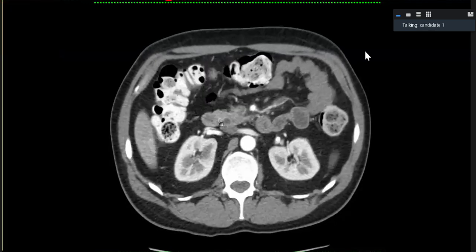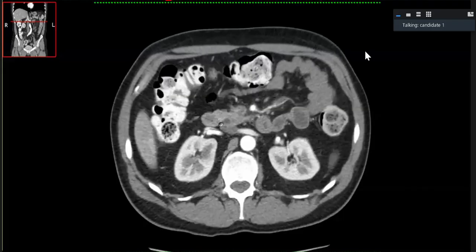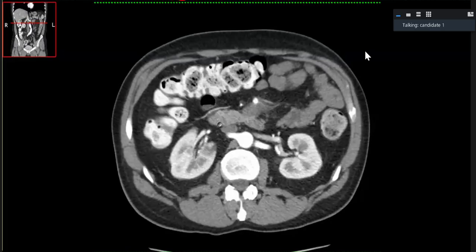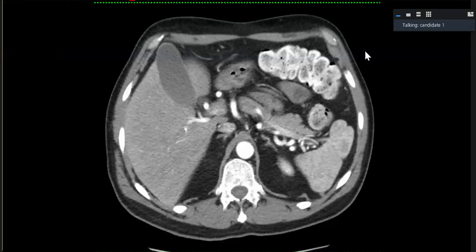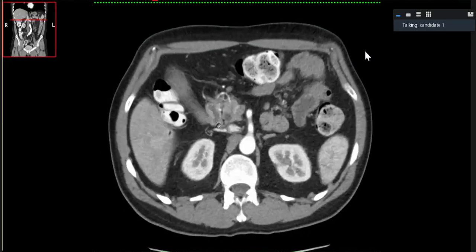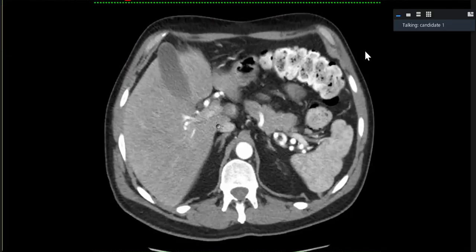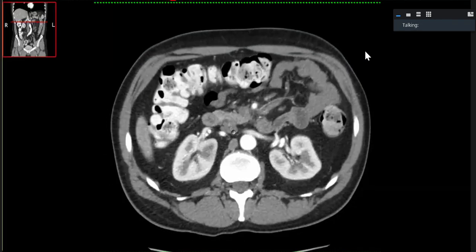Final diagnosis: multiple aneurysms seen in the medium-sized arteries, raising the possibility of polyarteritis nodosa with an underlying ruptured aneurysm seen in the vessel supplying the second part of the duodenum and one of the superior mesenteric artery branches. An urgent case.